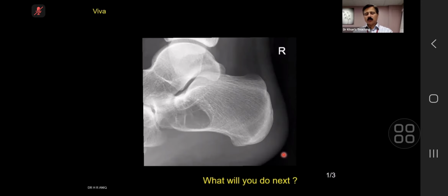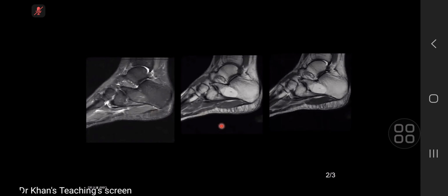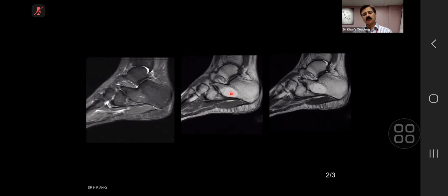Oh, as a matter of principle, keep yourself to MR, right? Okay. You see, in the 2B world, just osteoid osteoma is CT, otherwise MR. And in the real world also, this is what we do. And this is an MR. What is your diagnosis? Just give me the diagnosis. Compare this with this. It's a lipoma. Lipoma. In the lipoma, there might be a central calcification which occurs as low signal here.